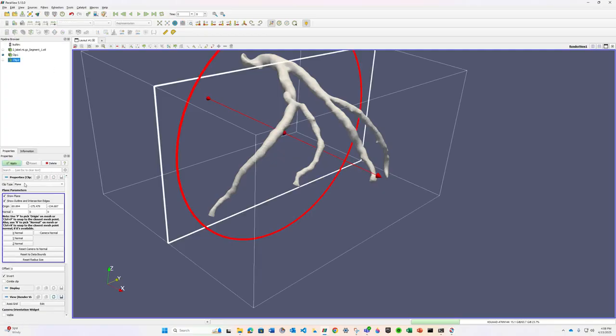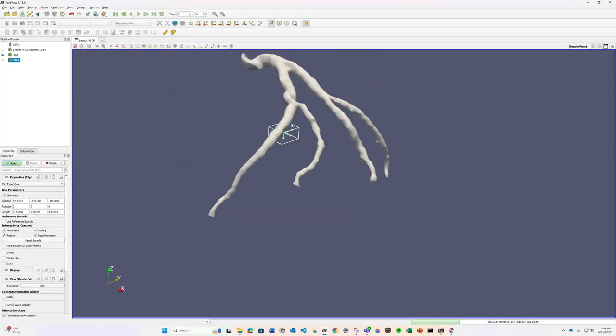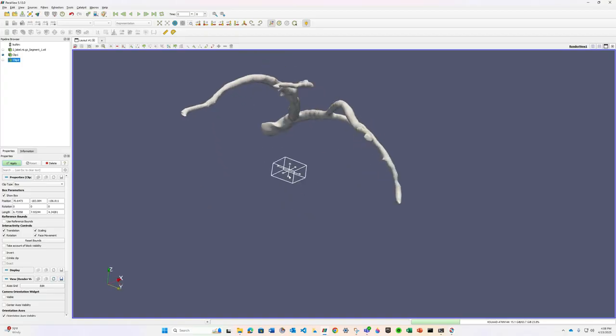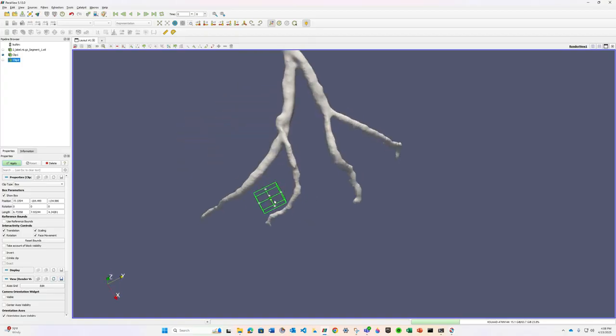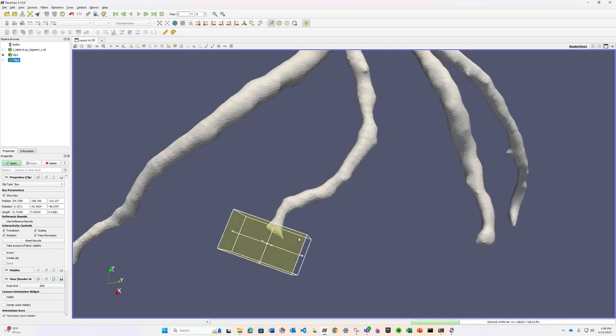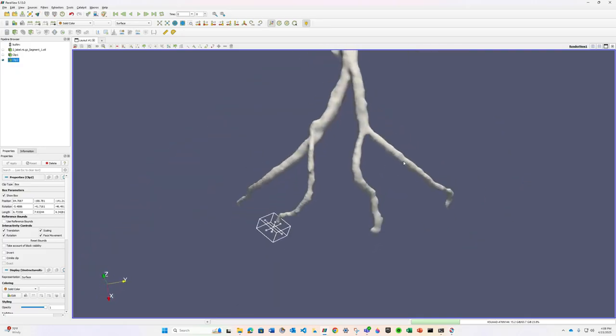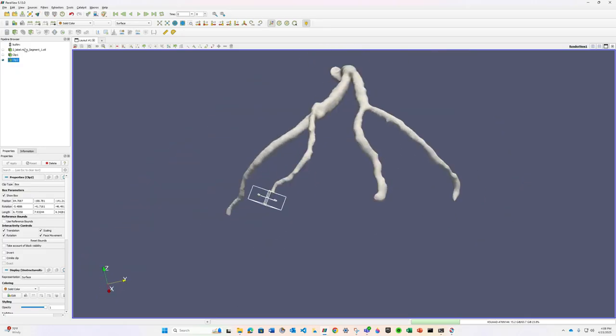Click the box again, set the drop to box, hit invert, right click, scale, move it around. Yes, it's a tedious process, but once you have it in place and you get more practice with it, you'll get much faster, and you put on some music and it'll feel like you're just floating. So yeah, you do that. That's another one. So I'm gonna stop talking now and just finish them.